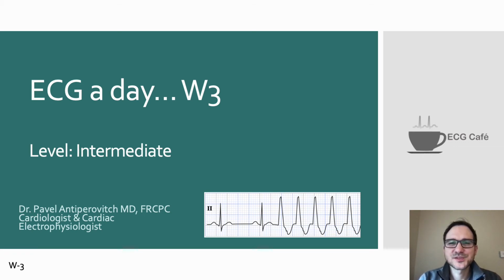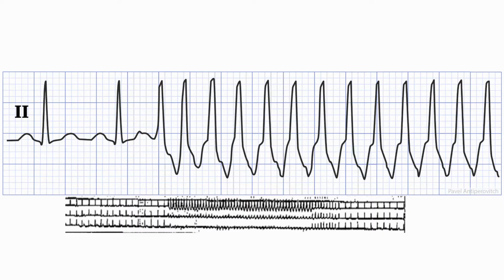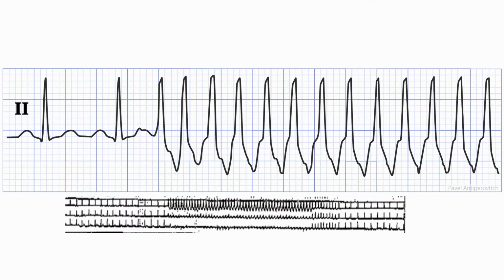Here we'll go through a single tracing to practice our approach to arrhythmia, and the discussion will be at an intermediate level. At this point, you might want to pause the video and give a shot at interpreting this ECG yourself, and then we'll discuss it shortly.